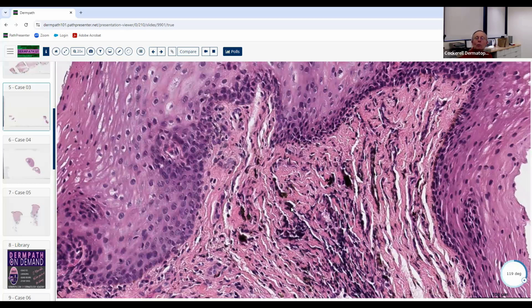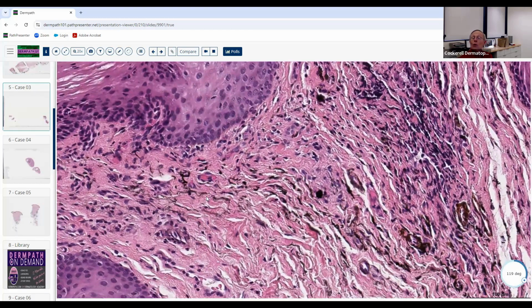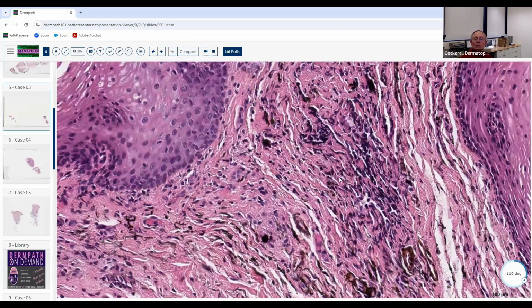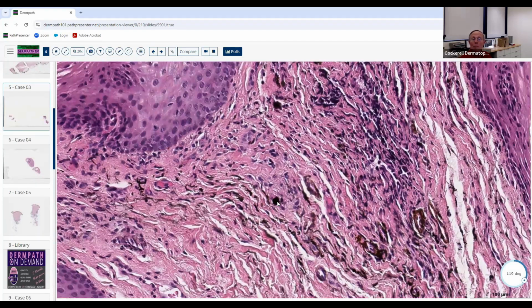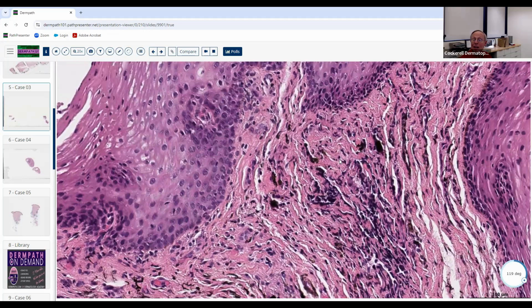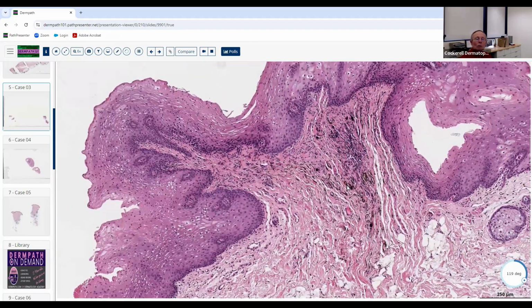And what's the last setting where we can get staining of the elastic fibers more diffusely? Argyria. Yeah, in argyria, somebody's using silver-containing nose drops or eye drops, or they're drinking it or whatever. So those are the three settings where we see this. There are other metals. We don't get into all the different diagnoses of the metallic things that can stain the skin, but this is an example of an amalgam tattoo. I don't think this one was a piercing. I think this was related to a dental process.